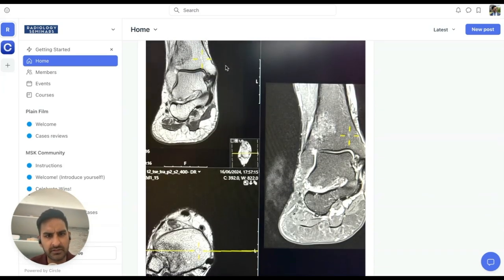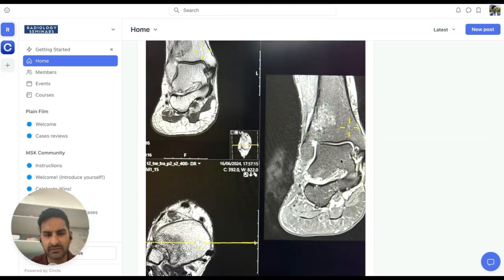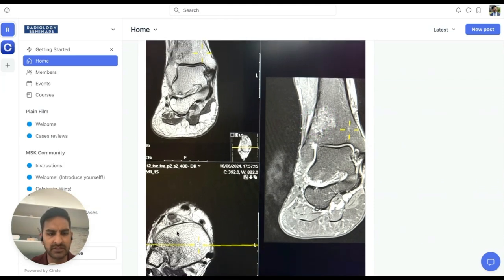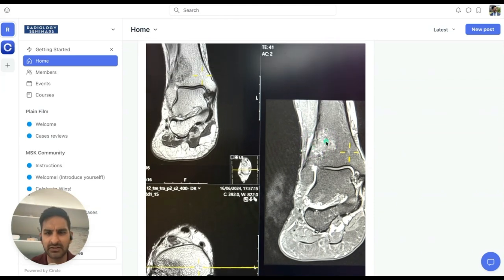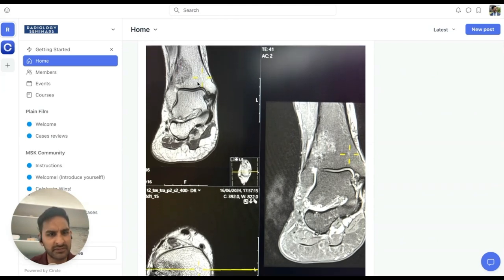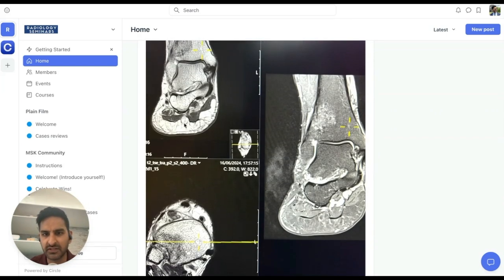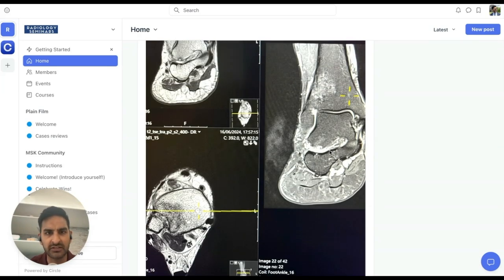This area looks like we've got a weird looking lesion located within this area over here. We've got the T1 weighted and fluid sensitive sequences, and we can see there's an increased amount of signal located here, slightly diminished signal here. So it looks like it could be a bit edematous, an ill-defined lesion. It doesn't look like there's any cortical reaction or any cortical displacement or fractures or anything like that. No soft tissue component. The soft tissue is very thin along the side of it as well. So it looks like a bit of an odd lesion actually, doesn't it?